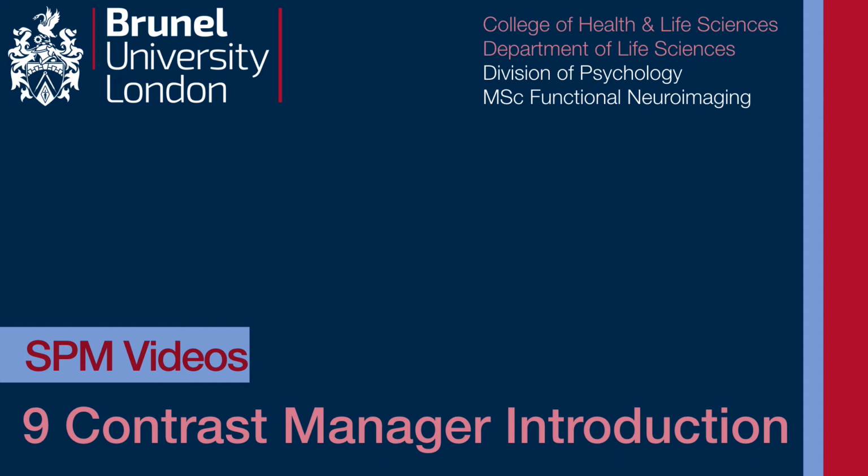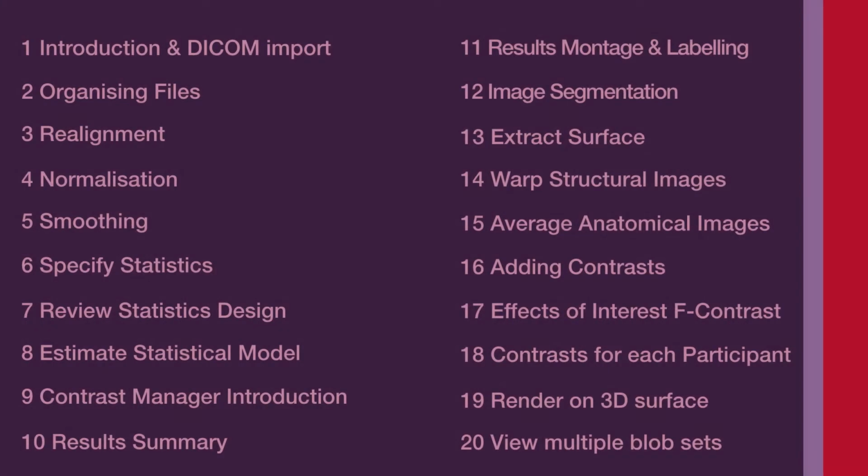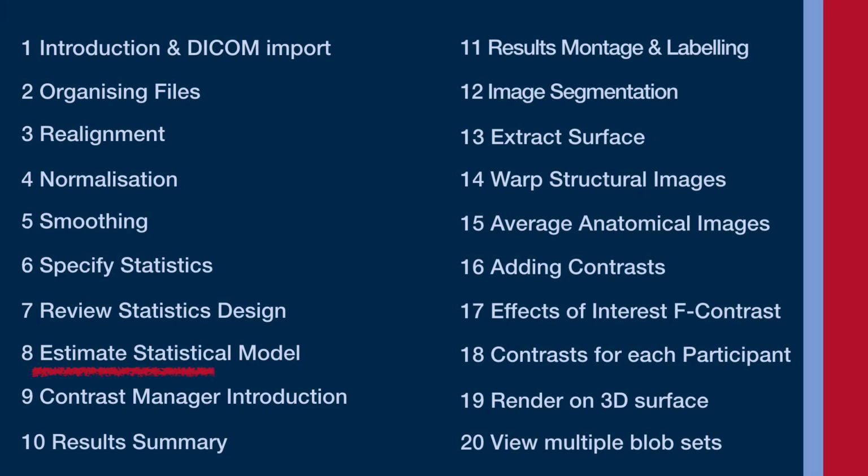We're at video number 9. We still haven't seen the results of the study yet. That's because we've got to use the contrast manager to specify the appropriate contrasts to compare different conditions. It takes a little bit of getting used to, so we're going to start off simple and get complicated in a later video.